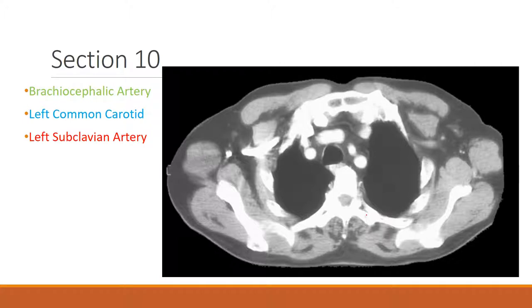All right, now here we're below the neck and we're officially in the thorax and the chest. So we're kind of in the upper chest, and we're right above the aortic arch. So what we're seeing here are the lungs. This would be one lung, this would be the other lung. Suppose I should be careful. Right lung and left lung. Just for your reference, this would be the trachea that you breathe through, air pipe.